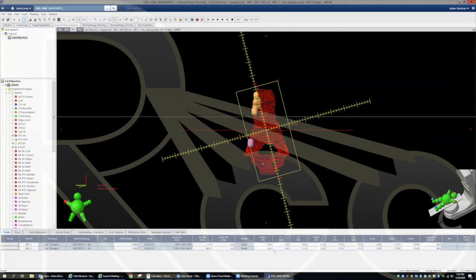The other thing is, on this particular machine, which is a TrueBeam, we're only able to open the jaws, I think it's 15.6 cm exactly, before the leaves can't travel any further. So if I had opened these jaws way out here, big open jaws, the MLCs might try to optimize, and MLCs on this side might get stuck all the way over here, optimizing something here, and the MLCs from this side would want to travel all the way over here to produce small beamlets, but they wouldn't be able to travel that far, so you'd be left with these big open gaps of beam.